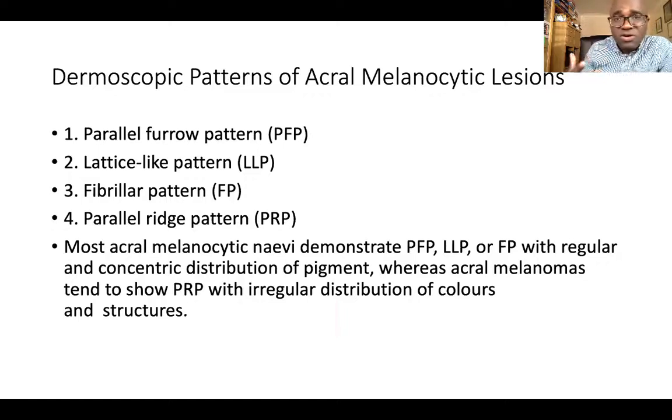This is very, very difficult to assimilate even for people with dermoscopy. I understand that, but with looking at more images and more practice of dermoscopic features of the palmar or plantar aspect, you'll be able to appreciate what we mean by these parallel furrow, lattice pattern, fibrillar pattern, or what a parallel ridge will look like where you're worried about a melanoma.